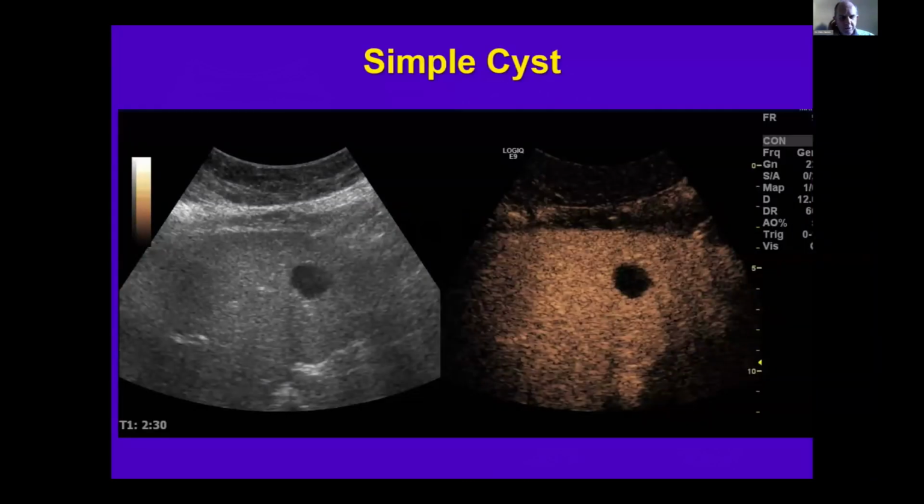So here's a simple cyst. Now, of course, the vast majority of simple cysts you don't need to image. You can tell immediately on B mode. But simple cysts will not enhance in any phase of contrast enhancement.